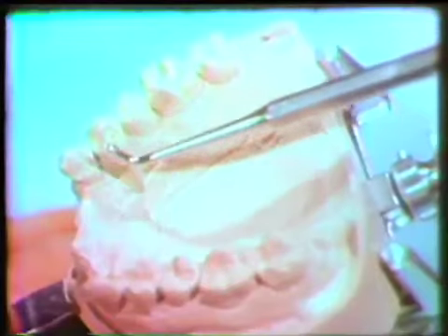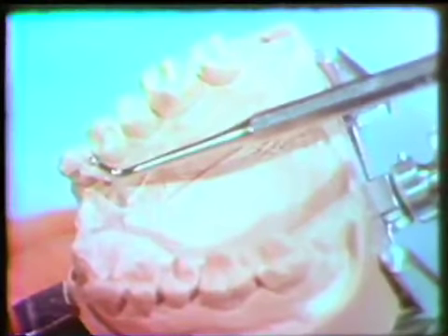Beads are scraped along the master cast to accommodate the edges of the major connector. The scraping of the cast by the dentist will ensure the desired outline of the major connector when it is fabricated in the laboratory and will provide positive contact between the edges of the major connector and underlying soft tissue. However, such scraping of the cast must never be carried out across gingival tissue.